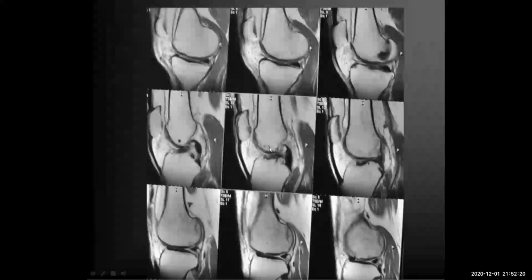Again, compared with this. So, if you say this is medial or lateral, obviously it is the medial. Why? For the reasons that we mentioned. So, where is the anterior horn? Sometimes it's really hypoplastic like this, bigger posterior, smaller anterior. Then see the posterior cruciate first. Then where is the anterior cruciate? Should be here. Absent. Since it is absent, this indicates a tear. Then we'll go for the lateral spine.